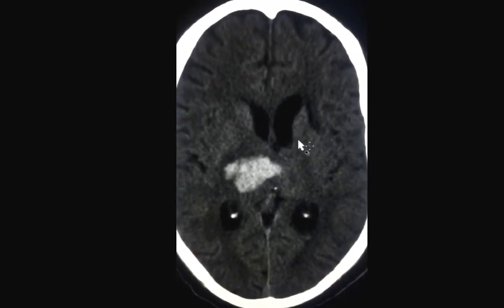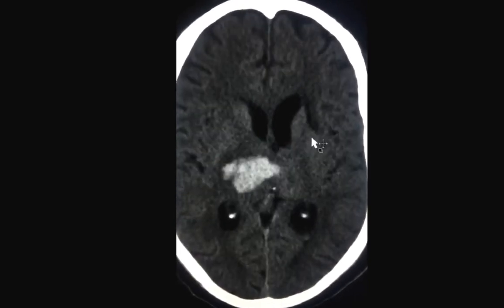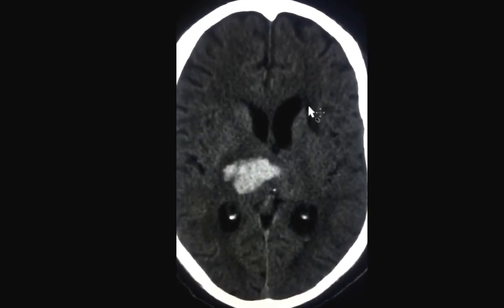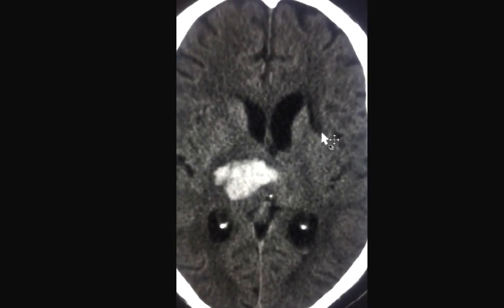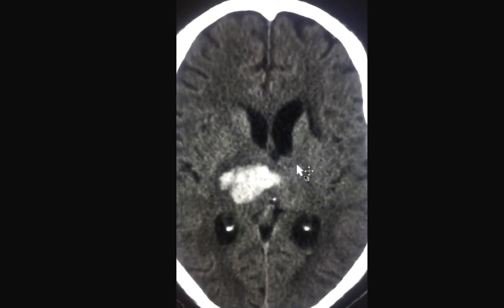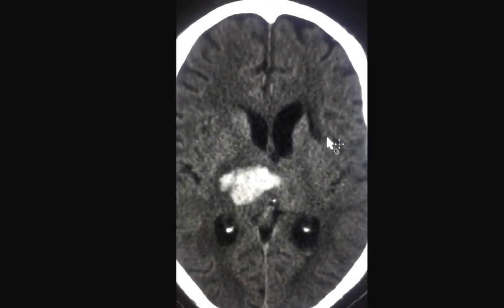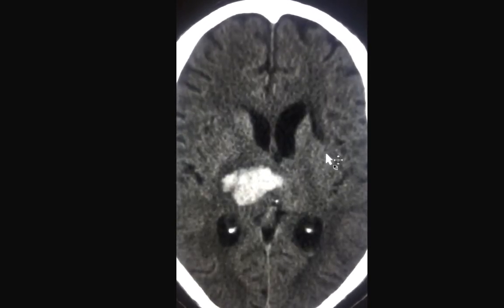Now that we know this fact, have you noticed the area of linear encephalomalacia on the left side in the striatocapsular region? Both an old infarction or hemorrhage may lead to an area of encephalomalacia. So knowing your anatomy and the common location for hypertensive hemorrhage, you'd call this an area of remote hemorrhage rather than an area of remote infarct.